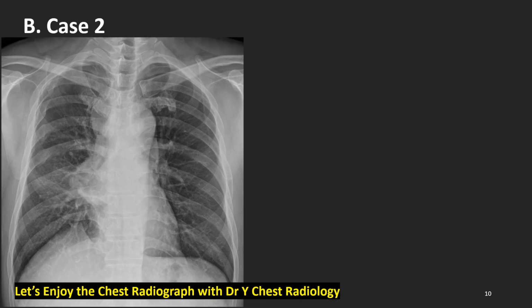How about this old man's chest frontal radiograph? Large bulging mass, not obscuring the descending pulmonary artery, hilum overlay sign, mediastinum based, another bulging mediastinal mass with right paratracheal stripe obliteration. Yes, a mediastinum based large bulging lobulating mass.